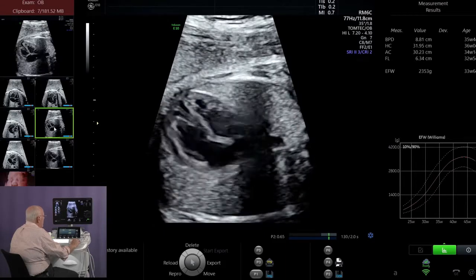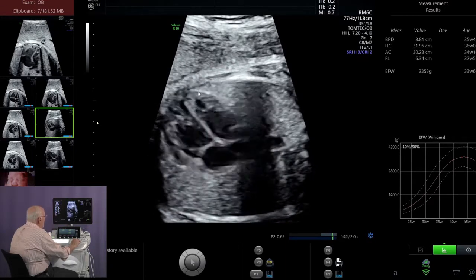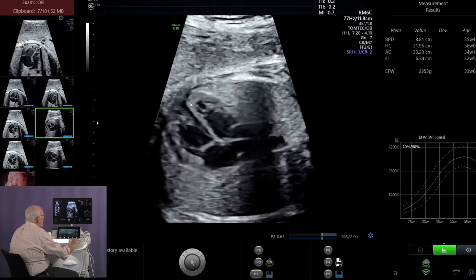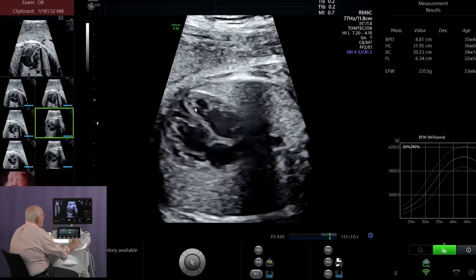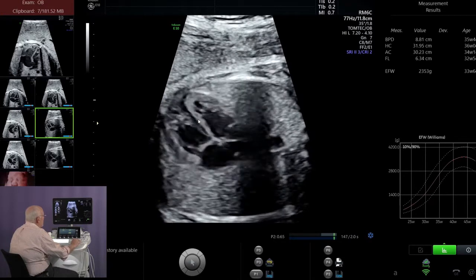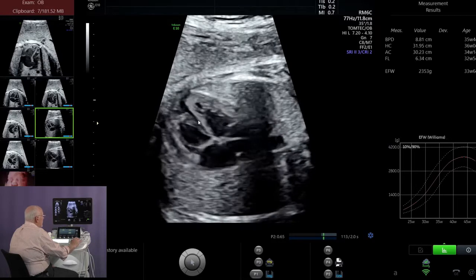This is another example of reorienting the four-chamber view, and this is probably ideal because you're at about a 45-degree angle to the ultrasound beam. You're actually combining lateral and axial resolution. You see very nicely the interventricular septal wall. Here's that bright echo that I mentioned earlier, and here is the septal wall of the left ventricle. So we have nice valve movement and a nice delineation of the walls of the heart. And this is probably the very best orientation for acquiring an image for Fetal HQ analysis.